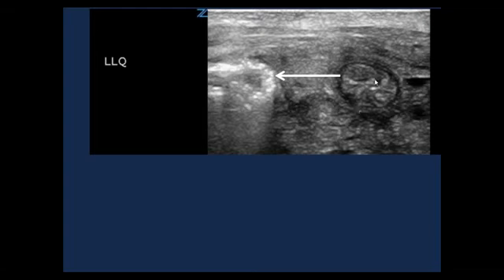In this image you can see side by side normal bowel wall with maintained signature, where the muscularis can be seen, the hypoechoic muscularis with the layers. If you look closely at the image you can see the 5 layers. And just beside it, you can see another loop with extensive pneumatosis.